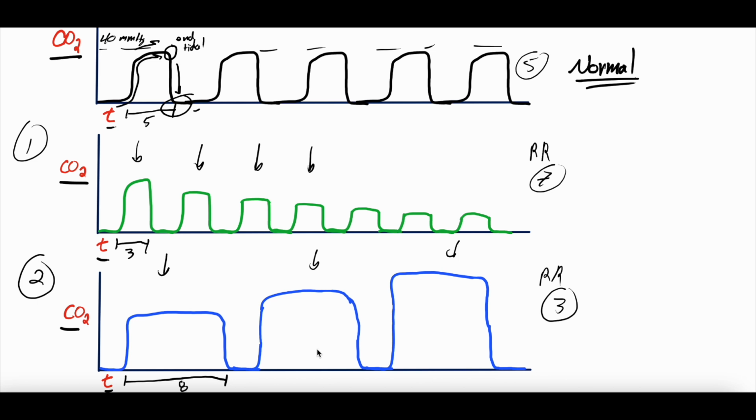So the duration of the breath is shorter. And then the peak of the breath is different. These are all universal peaks, whereas this one downtrends, this one uptrends. Now, if we break these up and think about what this means.